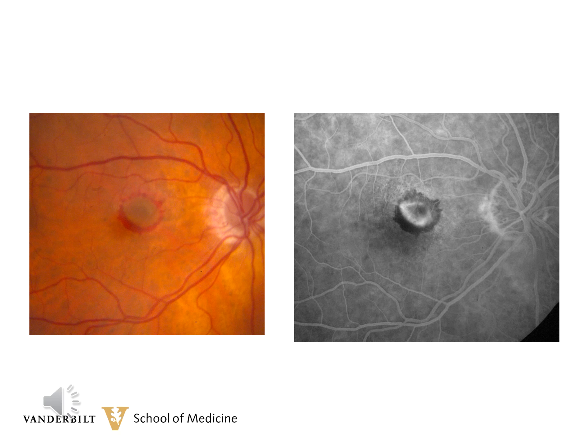Here is a 78-year-old female who has had blurred vision in the right eye for about 3 months. She stated that her vision is peripheral only in that eye. The color photograph shows a classic subretinal neovascular membrane. It is gray-green in color, and it has some hemorrhaging at the leading edge. The fluorescein angiogram shows hyperfluorescence from the neovascular membrane and blockage at the leading edge secondary to the blood.